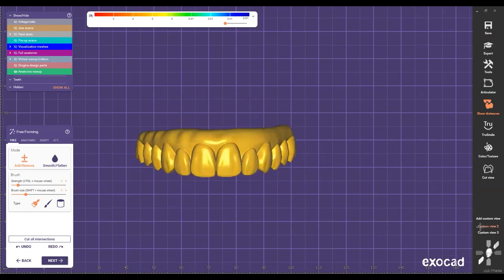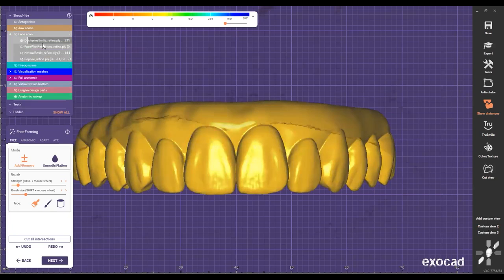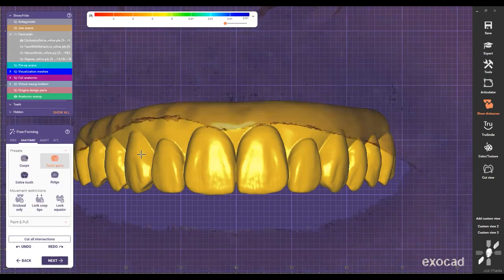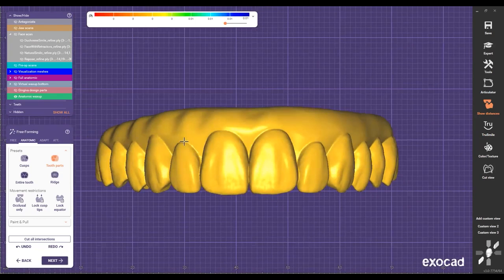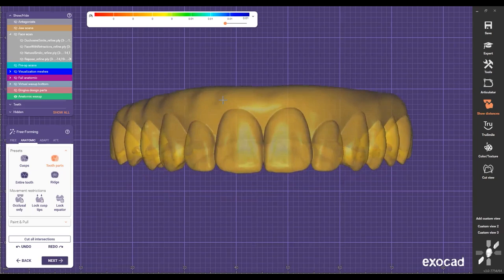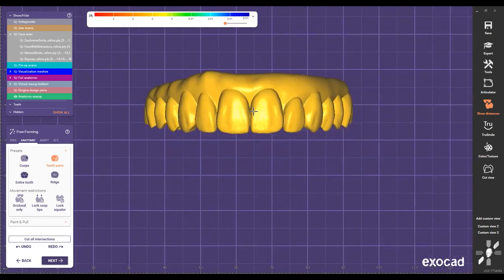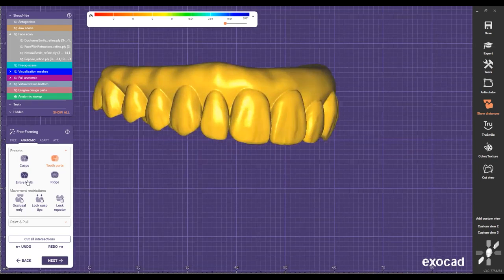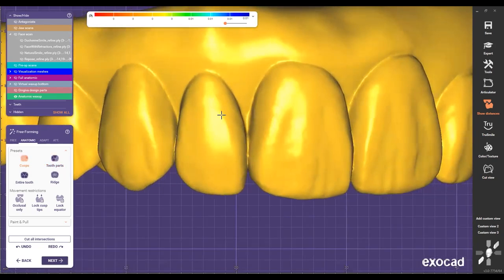And then I forgot to do this step. We were talking about how to fix these areas right here. So I'm gonna go ahead and do the Duchenne smile, and I'm gonna start pulling these areas right here, but without compromising. Before I take care of this, and then at the end I do the contacts. Okay, so here I go, and I want it to be kind of like 0.1 to 0.5 millimeter, a little longer here. In this case, I stretch the tooth. I'm gonna try to make it look normal.